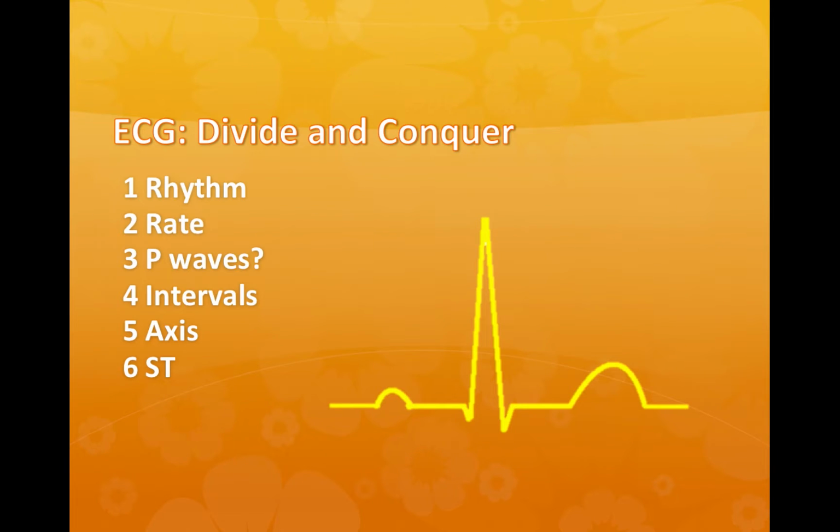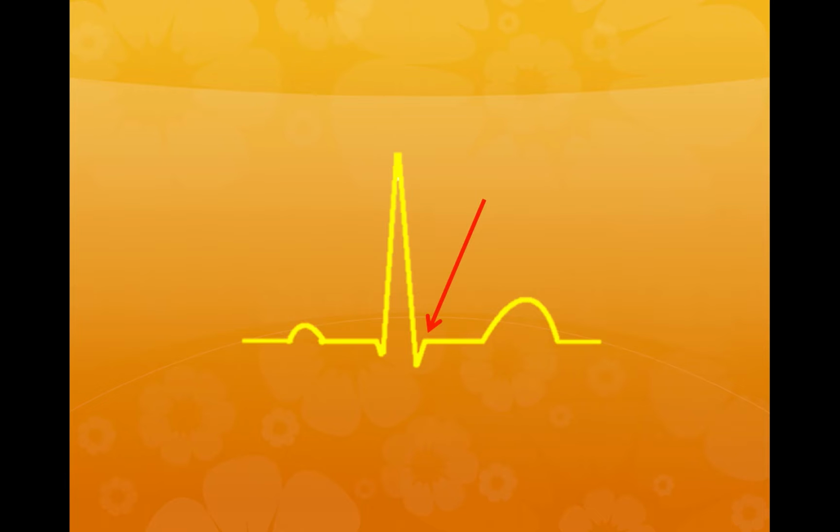So next, let's move back to where we were going, the ST segment. The ST segment is important, as we said before, for diagnosing ST elevation, ST depression. Well, not diagnosing it, but identifying it. And where we actually measure, typically, ST depression or elevation is at the J point. The J point is at the end of the QRS, so at the end of the S wave, and at the start of the ST segment. So this right here is the J point. This is where we measure ST elevation, for example.